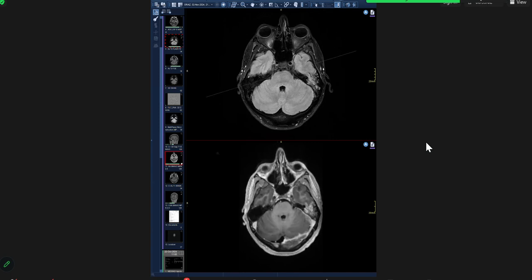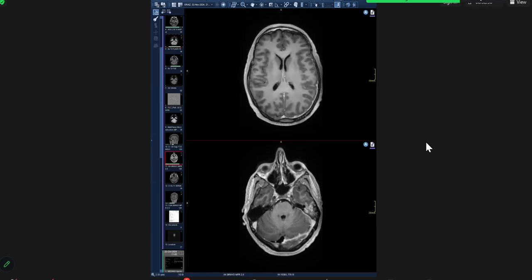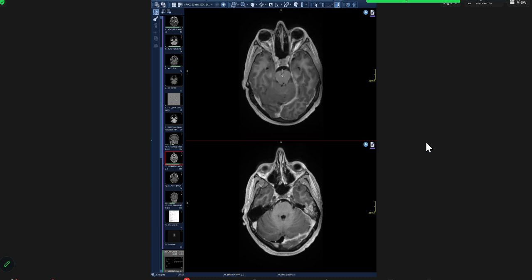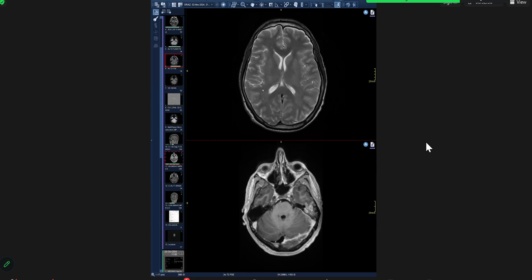And it is asymmetric because these patients present really early, like he came early. So he does have some degree of meningeal enhancement as well. You don't see that many meninges here. So he has leptomeningeal, he has dural, and then you saw the FLAIR hyperintensity. You know that there's something else sitting there except CSF, because on FLAIR, if there's only CSF in the subarachnoid spaces, you're not supposed to see that appearance. See this? Yes, ma'am.